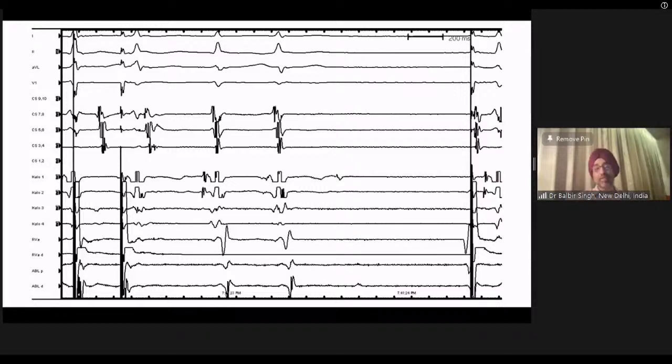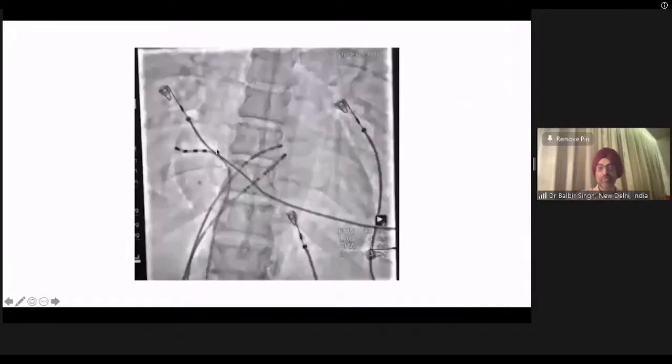But these patients very commonly also have AV nodal reentry. So this is an atrial extra stimulus, goes with a conduction on the slow pathway. You see an H jump followed by 2 echoes. And this was an ill-sustained AVNRT, which also we ablated.